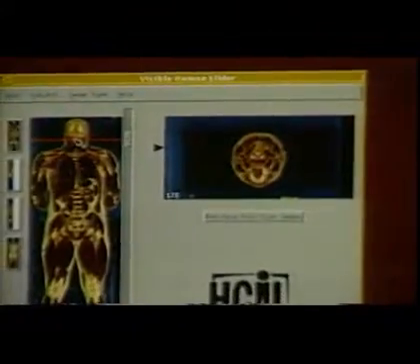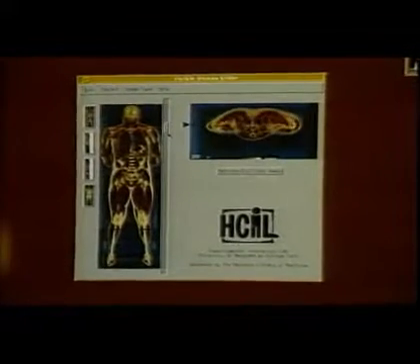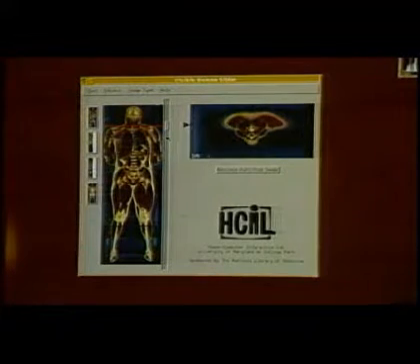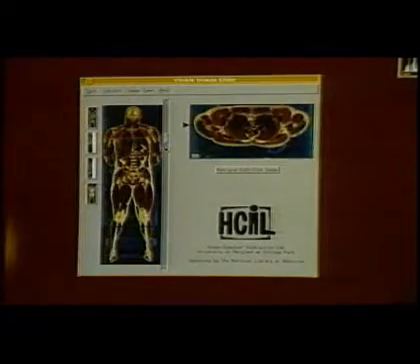In summary, this interface allows us to explore volumetric data using a 2D view with slider control through the third dimension. We browse with rapid, incremental, reversible actions while receiving immediate feedback. The overview helps to direct our search, promotes exploration without penalty, and provides context for the local view.